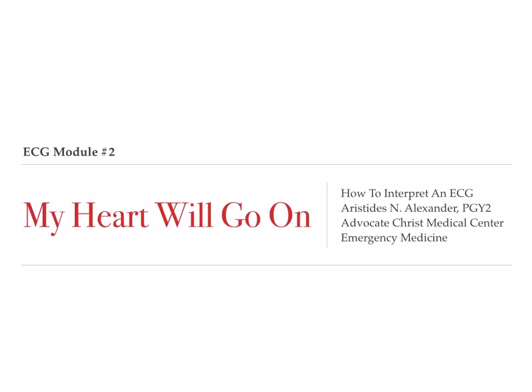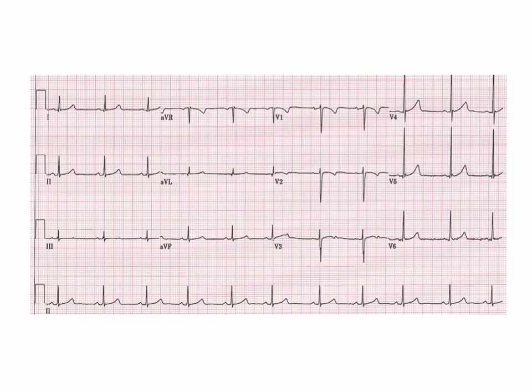This is the second EKG module titled My Heart Will Go On, How to Interpret an EKG. So here's a picture of an EKG in all its glory. I'm assuming that most of you have seen at least the one EKG in your medical career, but in case you haven't, here is a nice example of one.